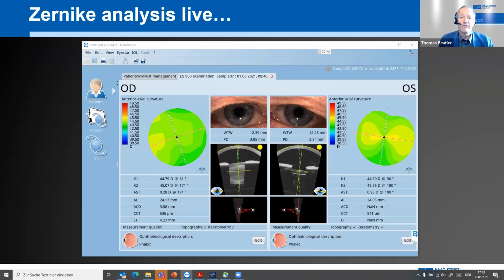It's also going to have a chamber angle analysis feature, and an imaging feature that allows some measurements, either just pixel-wise or comparative measurements, but also real measurements in millimeters, depending on where you're measuring in the OCT image. But that's actually planned, and that's soon to come.